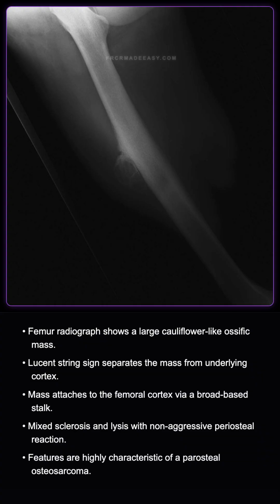A 32-year-old male presents with deep progressive thigh pain. I am showing you the radiograph of the femur. Describe the findings. Okay, assessing the provided imaging.